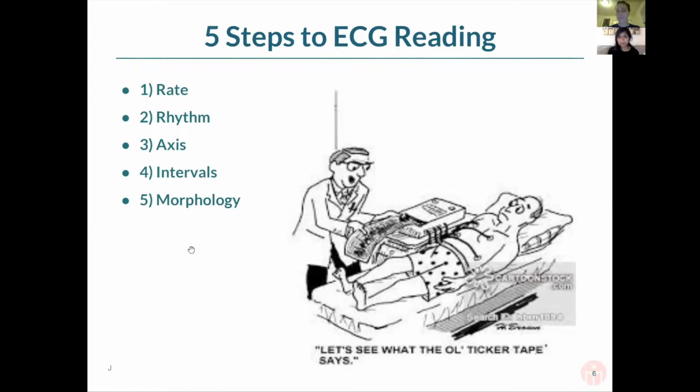And lastly, the QTc or QT interval is also very important to check because there are a multitude of syndromes and drugs, medications that can cause a QT to be long or short. And there are risk factors in both of those situations. And so it's always important to know what the QTc interval is, especially if you're going to be giving a patient a medication that can potentially prolong it even more.